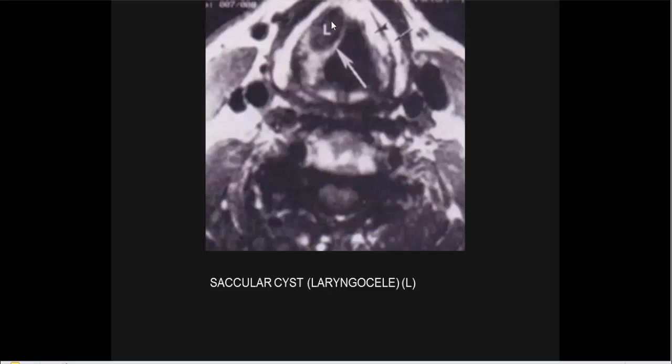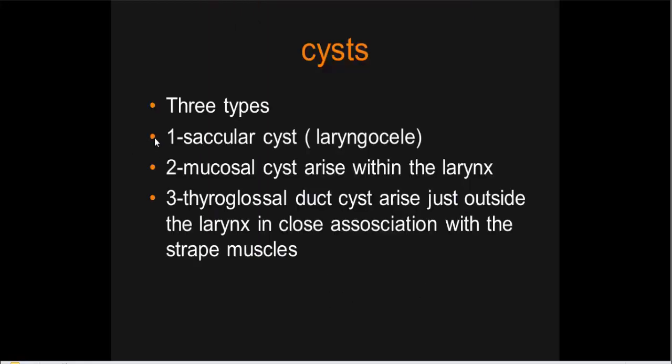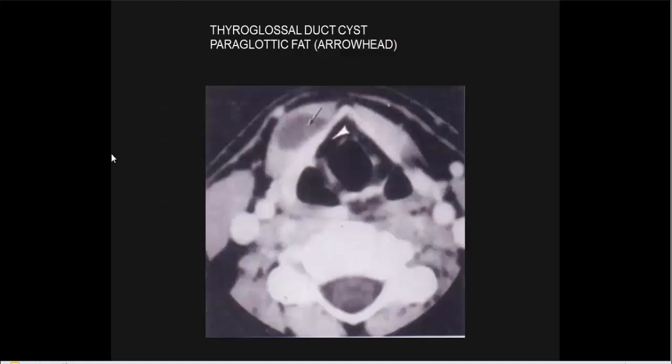The differential diagnosis of the cyst here is thyroglossal duct cyst or mucosal retention cyst of the larynx.